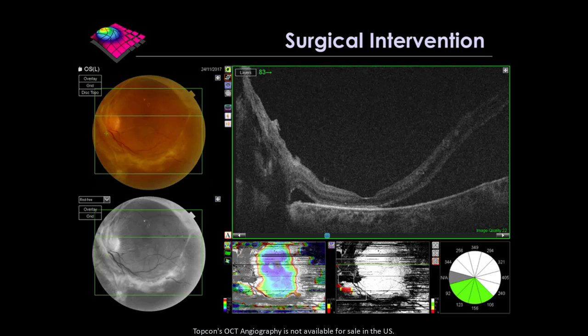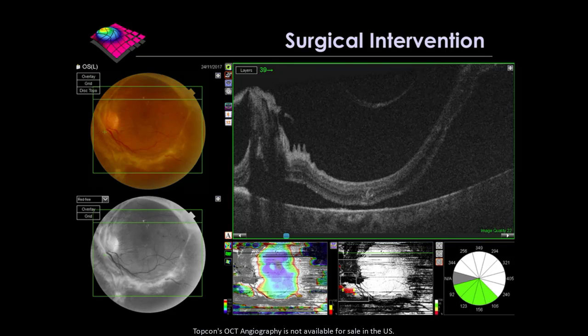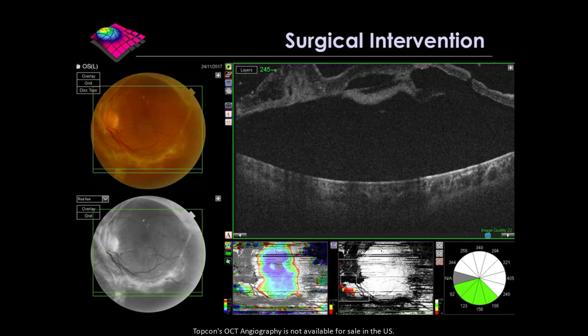But in fact, if you pay attention and you look at the wide field OCT and you look at different cuts and compare it to the way it was before, you're seeing the whole retina is being pulled off. And we can take different cuts. And so what was before more of a schisis type picture is now clearly frank retinal detachment in these cases. You can see on this cut down below, and then I think there's one more. Look, it's like way off.